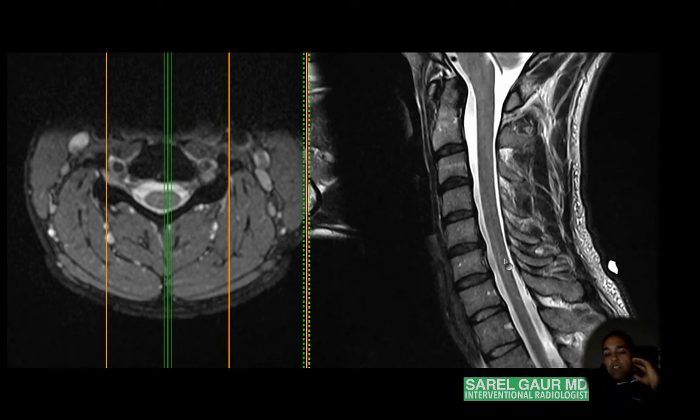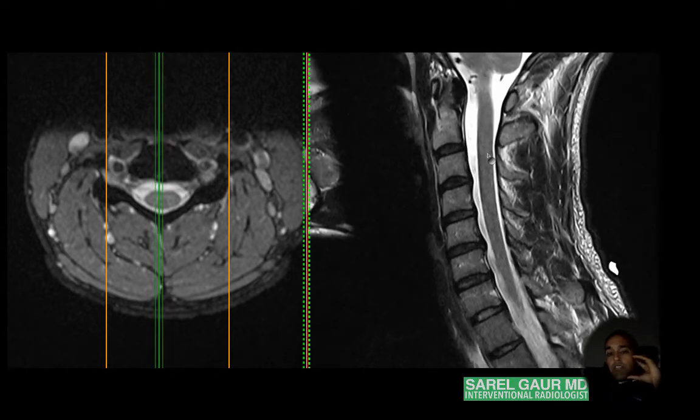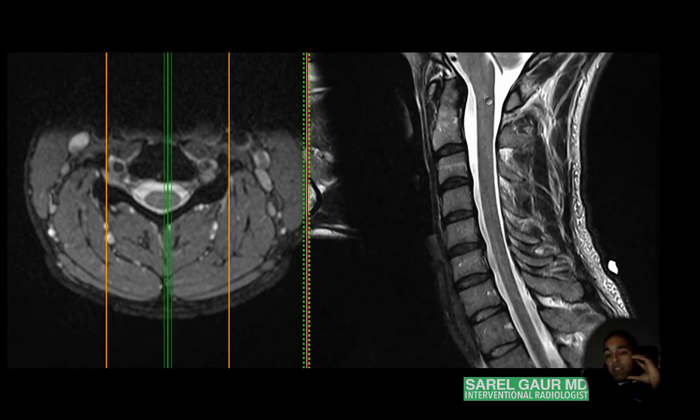Theoretically there could be a lot of lesions along the cord. There's primary cord neoplasms, which can occur just like there's primary brain tumors, and they're going to look really strange and aggressive, and you can pick them up if you look at the cord. There could be inflammatory myelopathies. You could have someone with MS, and they're going to have high signal plaques throughout the cord.